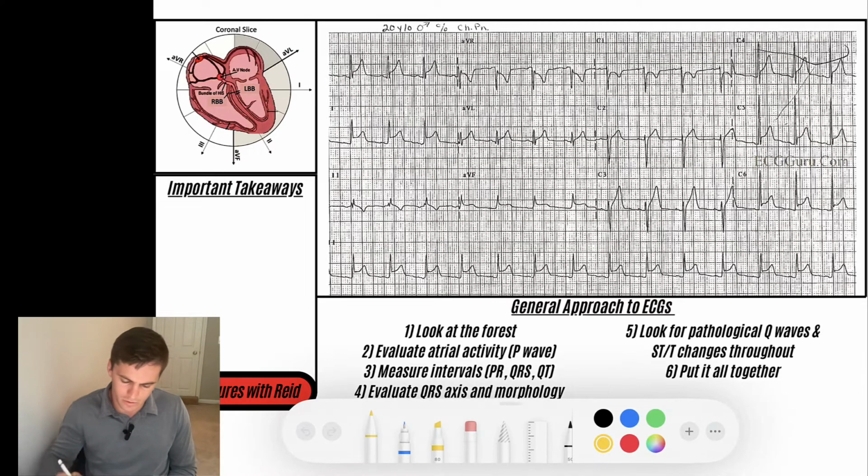So here's our first one. You'll notice we've got a narrow complex rhythm. We're not going to go through the whole ECG here.